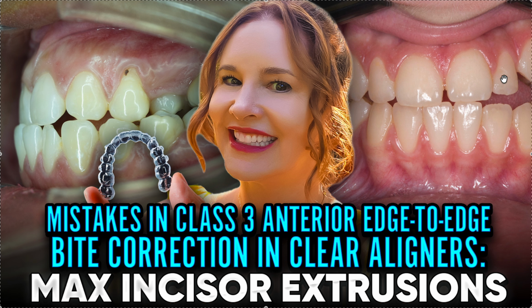Of course, the other option in these types of cases is you check the Ceph, you check the CBCT, and you see, oh, maybe these are upright, maybe I can just flare these out a little bit. Let's see how much bone I have, let's see the incisor inclination. If you don't take that Ceph, or you don't integrate that CBCT into the plan, you don't know what's best for the patient. That's why I always crack up. Anytime you have an AP or a sagittal case, you really have to take that Ceph, or if it's an adult, put the CBCT in the plan.